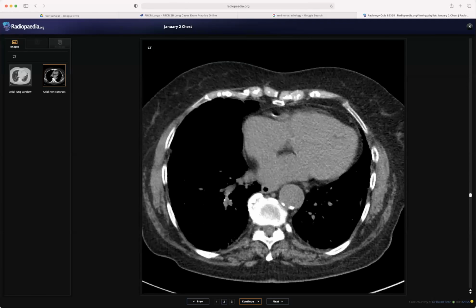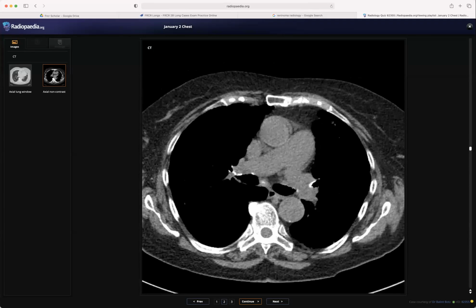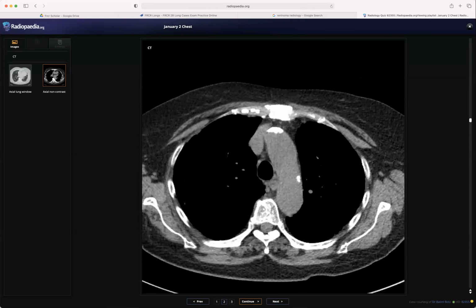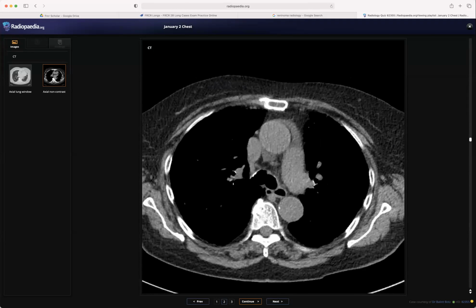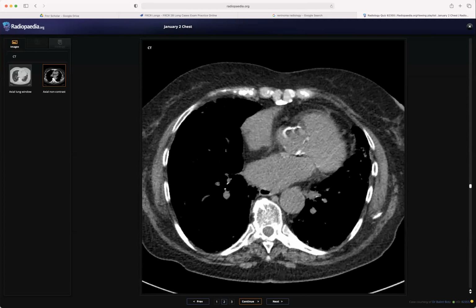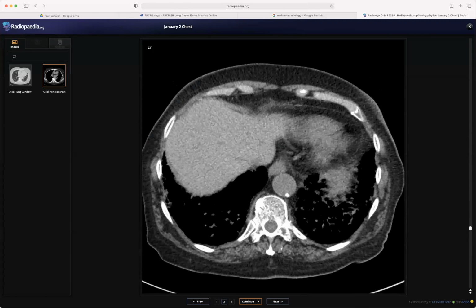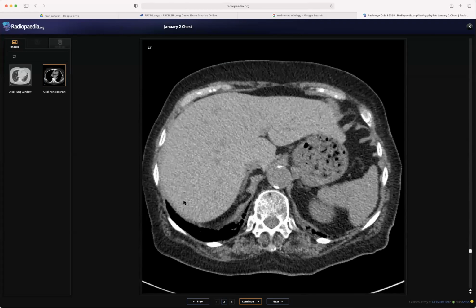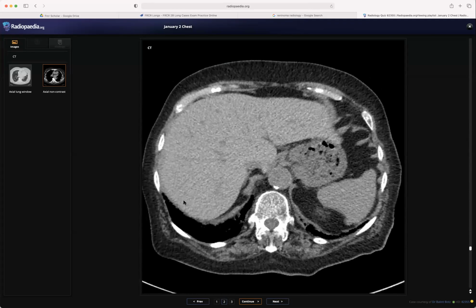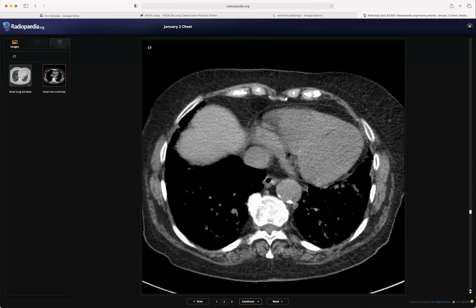So with the provided images, my diagnosis will be interstitial lung disease of UIP pattern. There are some mediastinal lymph nodes, but no definite calcification noted within these nodes, and the nodes are appearing small volume. And some liver is appearing a bit hyperdense.